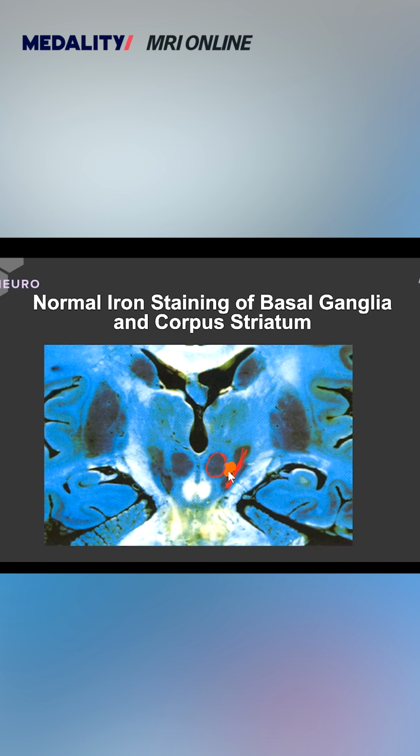Now, unfortunately, it doesn't have a very high specificity for it, but in mid to late stage Parkinson's disease, the absence of it is an important distinguisher of pseudo-Parkinsonian syndromes. So you would like to see it in mid to late stage disease.